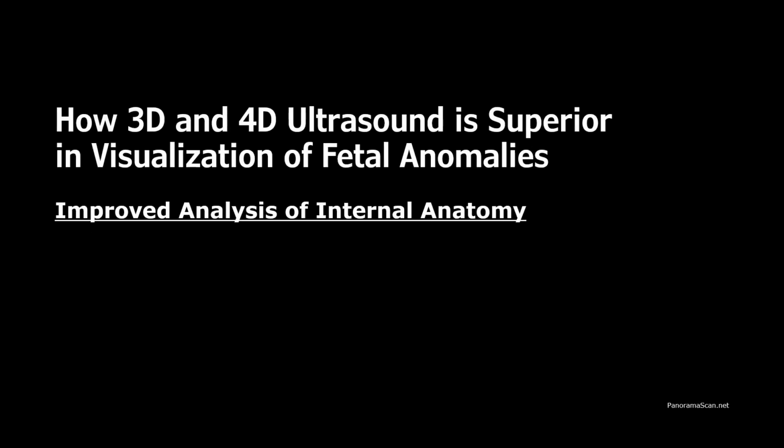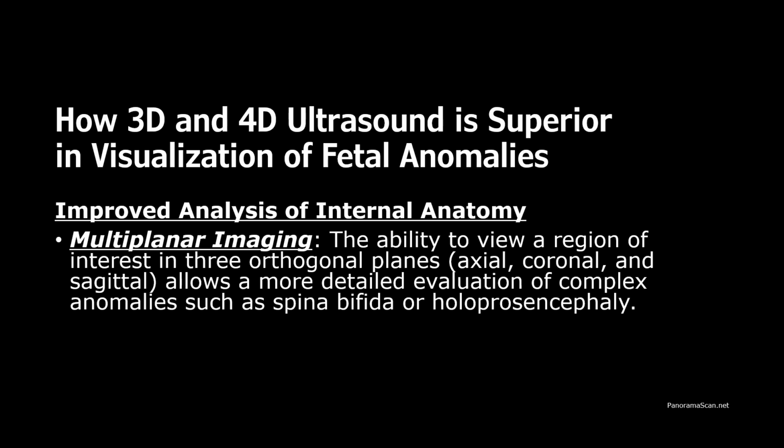Improved analysis of internal anatomy is another significant advantage of 3D and 4D ultrasound over traditional imaging techniques. Multiplanar imaging.